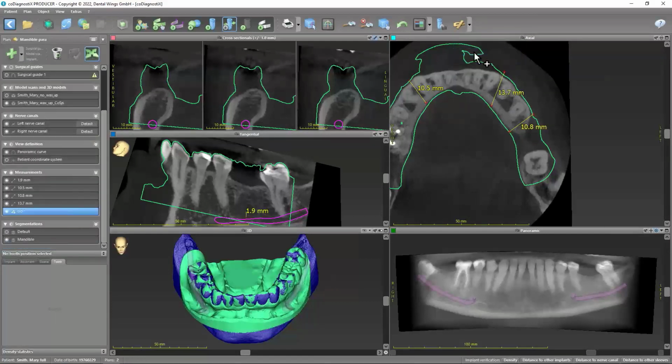Okay, the same certainly what we have is angulation. You can measure angulation, getting a starting point, first axis, and now the next click allows you to measure angulations, for example, for abutments or whatever you want. The auxiliary lines are sometimes helpful if you want to make the implant axis longer or the crest level longer, then you can do this.